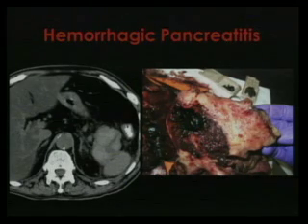This is pre-contrast, previous to the biopsy. They did the biopsy 1 time, 2 times, 3 times, blood came, and the surgeon decided to operate on the patient. They did the distal pancreatectomy, splenectomy, and resected the adrenal.